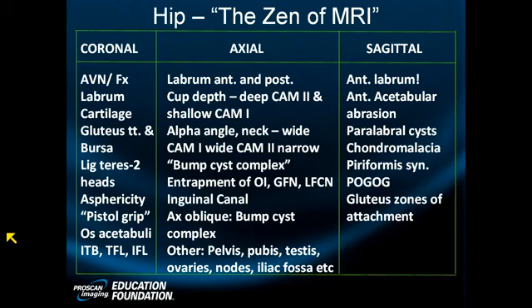The hip contains plica, normal fibrotic reflections. They can be near the femoral neck, the so-called Weibrecht plica.